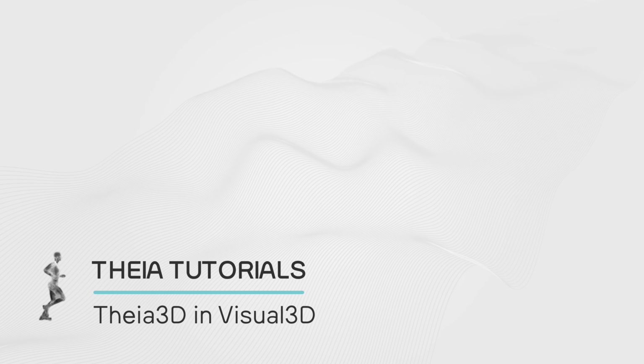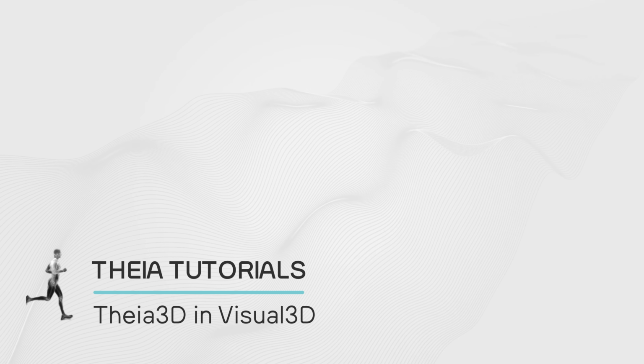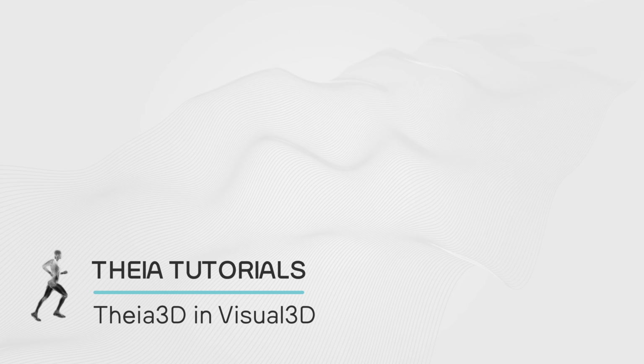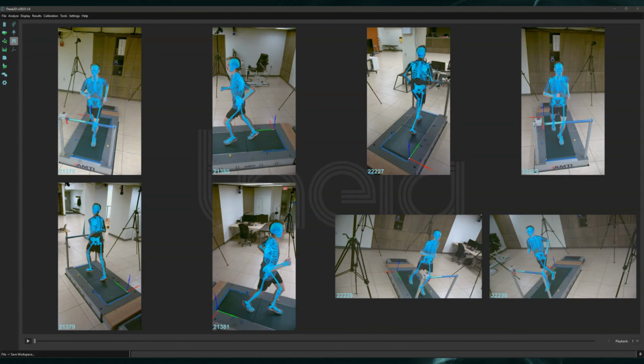In this video, we will demonstrate the interaction and functionality of Theia3D when paired with Visual3D, including opening analyzed movement trials in Visual3D and discussing the signals contained in Theia3D output pose-C3D files. Visual3D is a post-processing software that can be used to analyze and perform calculations on movement data in C3D file formats. Therefore, in order to open Theia3D movement data in Visual3D, you must first analyze a movement trial in Theia3D.